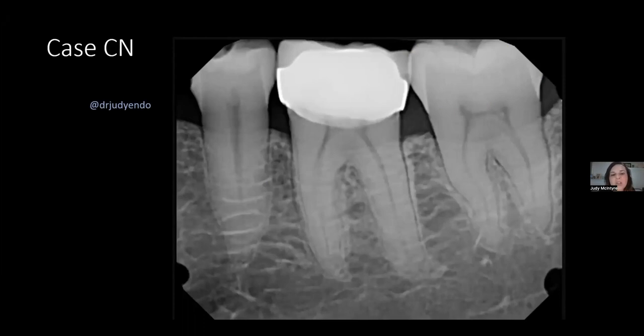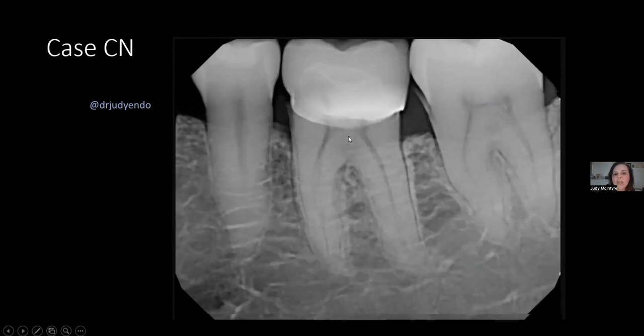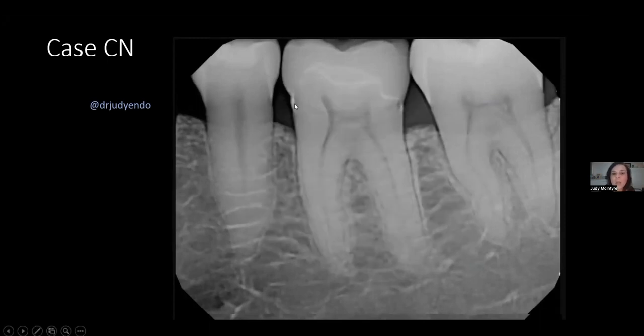This patient had a crown replaced. And again, let's focus and trace the horizontal bone. It looks nice and uniformly dense. And here it kind of doesn't. And then we pick it back up. She had this crown replaced, I'm not sure why. It looks like a great crown. Again, a PA was taken. And then she became symptomatic after this crown was placed. And again, this image shows a little bit better, but it's still divoting there a little bit, right? It's not as dense as on distally.